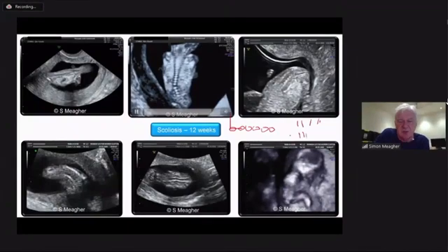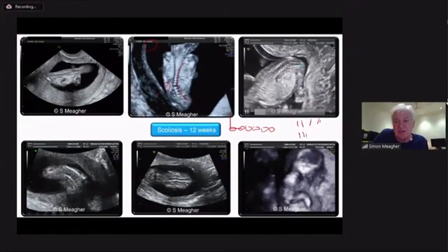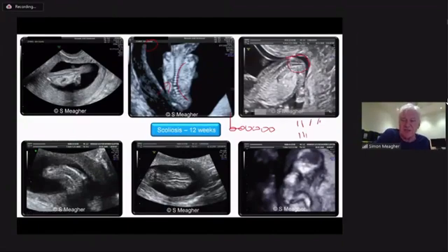If you go through the process of looking at that on 2D and looking for a missing block with the tilt of the spine, you can confirm with 3D. This is at 12 weeks and 4 days, showing that tilt in relation to a hemivertebra. You may also find sacral agenesis. So you look at the base of the spine, you see no ossification and absence. The iliac crests are readily visible at a first trimester scan.